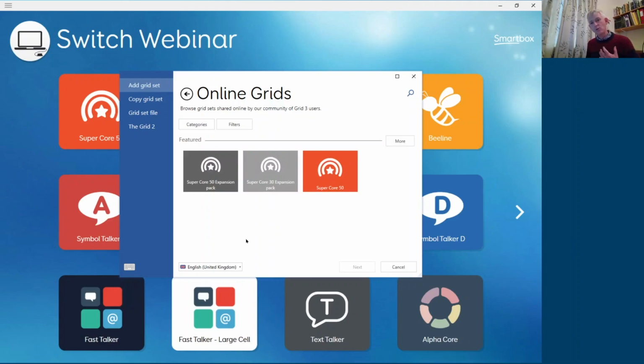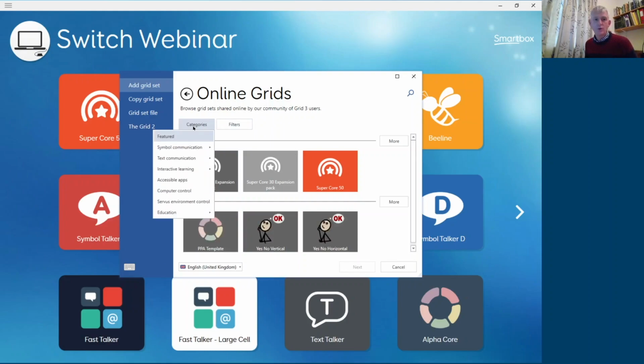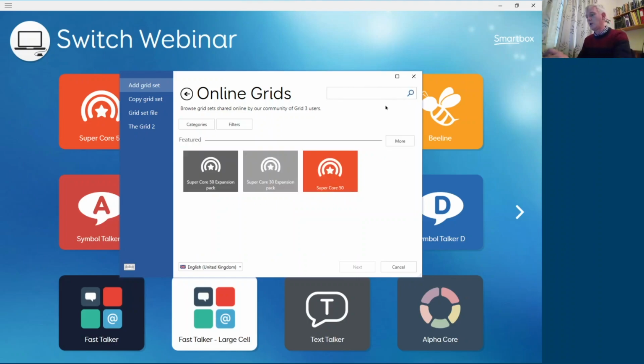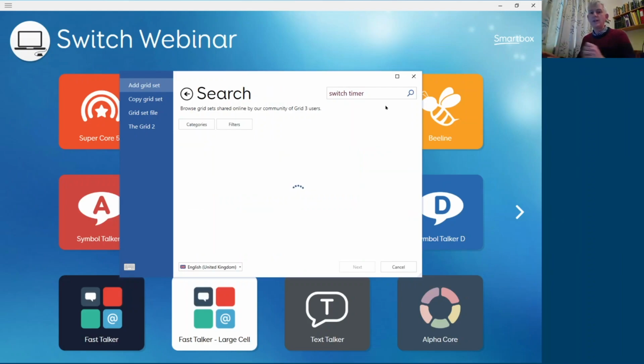And by the way, as I touched on in part 1 of this webinar, this is a great place to look for switch content, because you can look for content by a category, and you can look for it by access method. If something has been particularly built with switches in mind, it might be worth looking here. I'm going to look for something called Switch Timer, which is a resource to help establish the best switch timing for somebody.